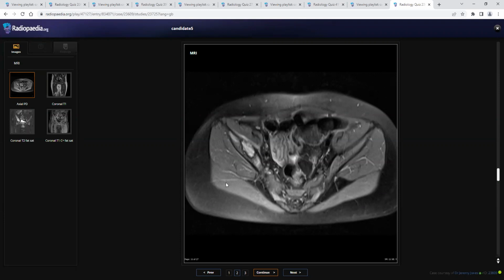In this age group, I'm suspecting LCH. What else? For differentials, I would not keep neuroblastoma metastases because this appears to be a bigger child. And the lesion is a bit corticated.